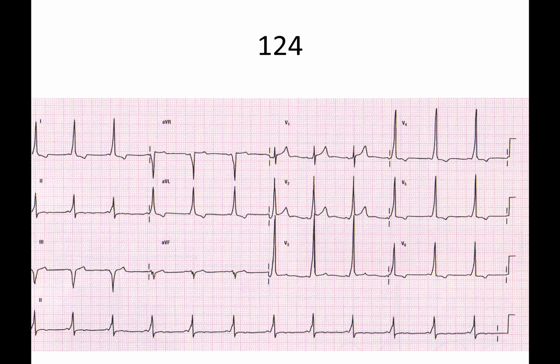All right, so let's take a look and practice what we've been learning. So step 1, rate. Step 2, rhythm. So our rate for this slide, and again, this is in your handout. There's some larger ones to be seen because I know it's difficult to see this on the screen sometimes. You are looking at, apologies.